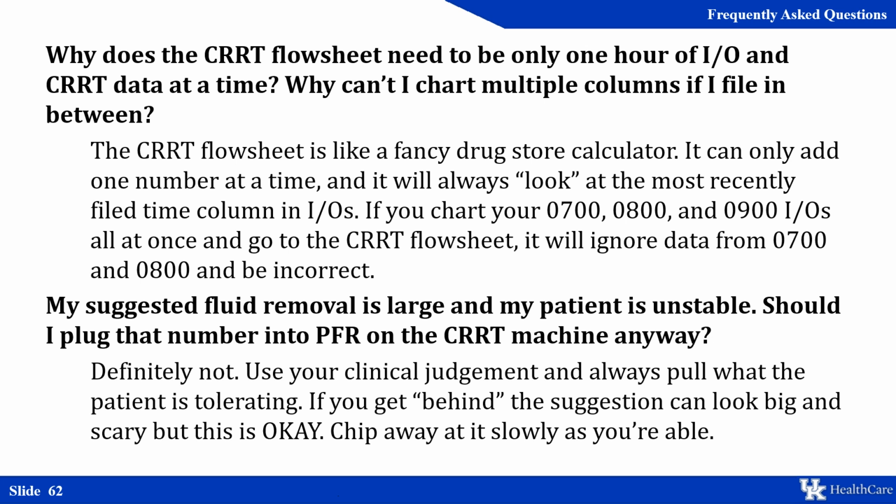If you've charted 3 hours of I's and O's and you start to do multiple hours on the CRRT flow sheet, it's going to ignore data from 7 and 8 because it thinks you've already done it. It will only look at 9 o'clock.